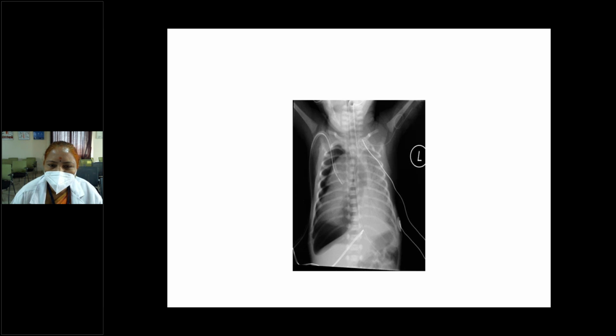Skin and subcutaneous tissue are normal, ma'am. Okay. Increased intercostal spaces, ma'am. In which side? Right side. Okay. Intercostal spaces are widened. Anything?